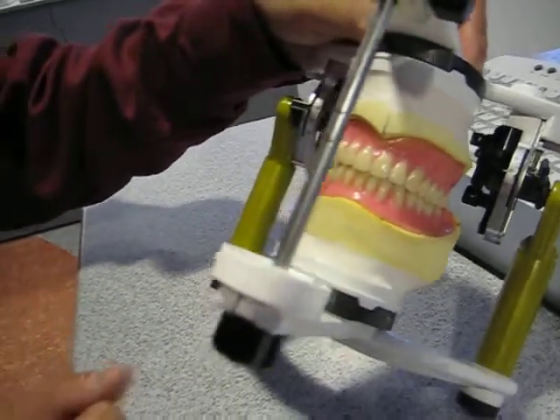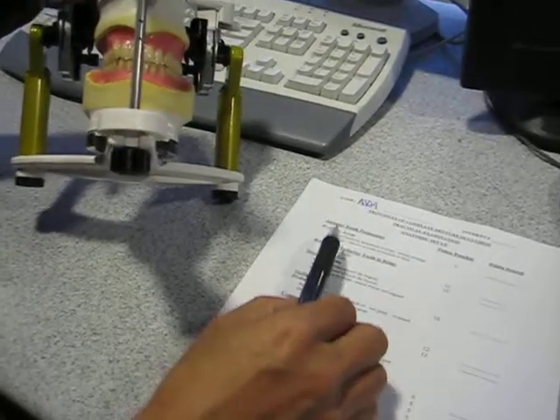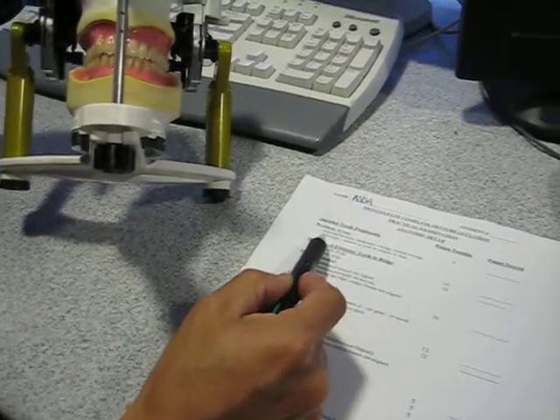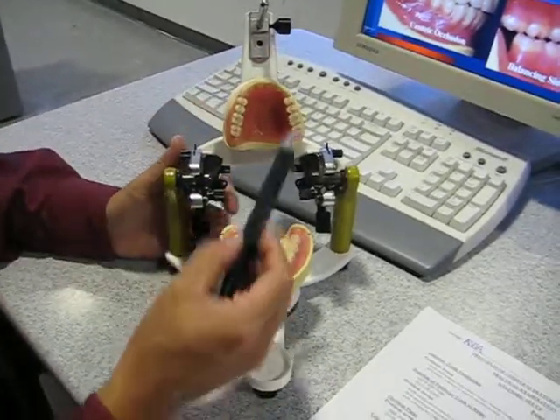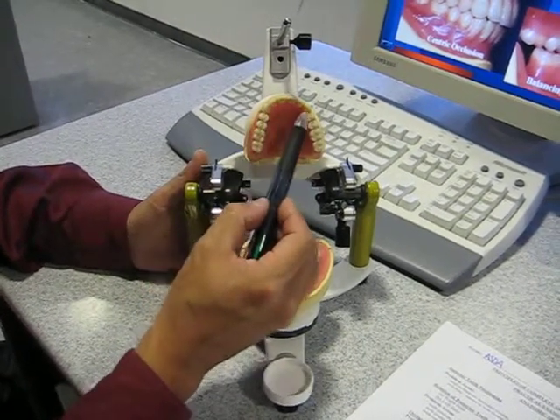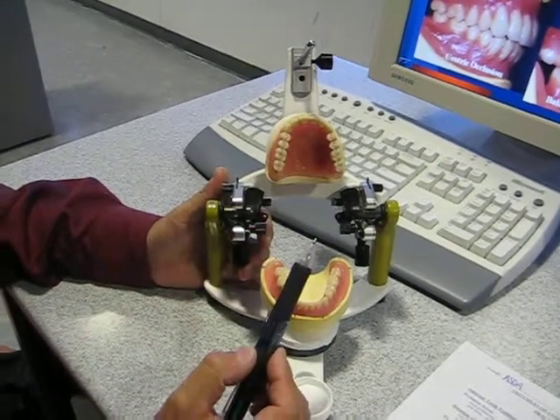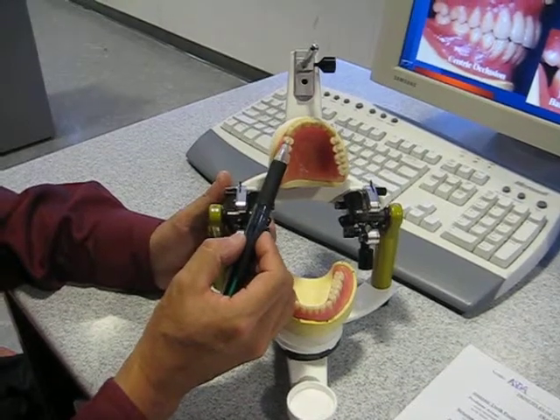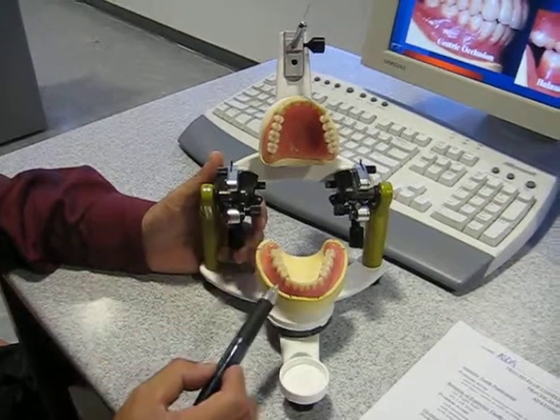Now, to get down into specifics, when we look at anterior tooth positioning, we're going to be looking in a number of areas. Starting out really with the arch form, okay? Whether the arch form is narrow or wide in relation to the land of the cast. Now, one of the first things that we notice in this particular setup is the arch form tends to be a little bit wide anteriorly. Okay? And that's going to cause some potential problems in terms of setting the posterior teeth a little too wide, getting us off of the ridge in the premolar region here.